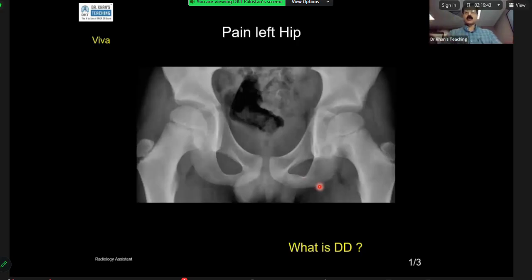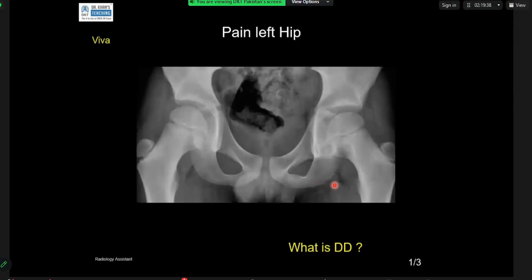So, what do you think is the finding on the left side? Thank you. Frontal pelvic radiograph of a skeletally immature patient. There is a rounded lucent lesion within the proximal femoral neck, which is eccentric and close to the medial margin. There is evidence of surrounding sclerosis. There's no periosteal bony reaction or soft tissue bony component. On review of the remaining skeletal components, there are no abnormalities or similar lesions that I could see in the femur, ilium, or the pubic bones.